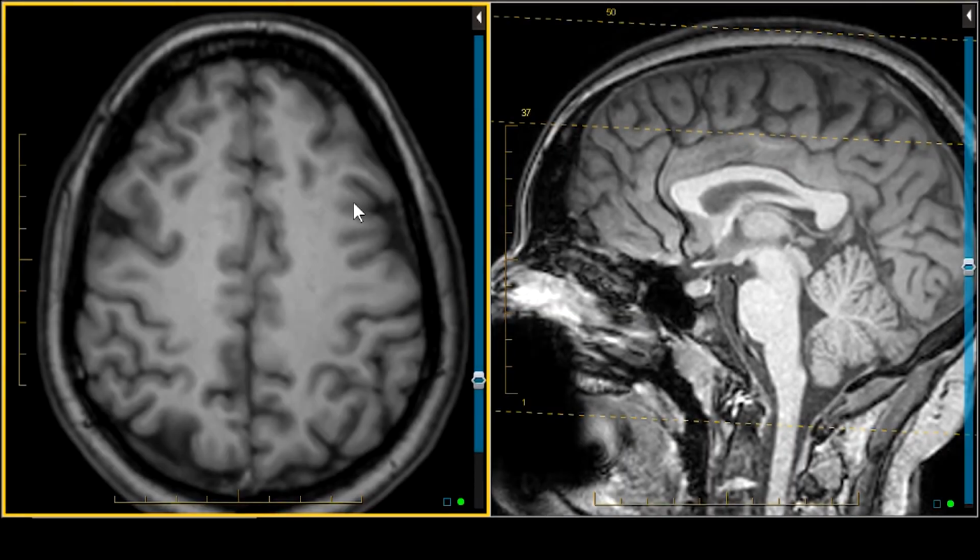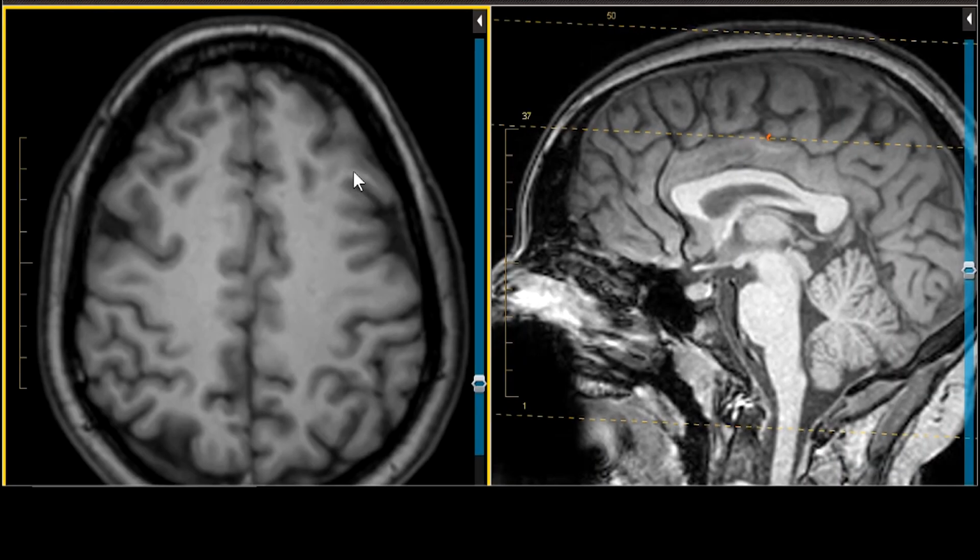Let's take a look at the pars marginalis in the axial projection. Now, if I were to localize the pars marginalis in the sagittal projection, the continuation of the cingulate sulcus following it on up to the pars marginalis or marginal sulcus, that corresponds to these two foci that look a little bit like a droopy mustache, if you will.